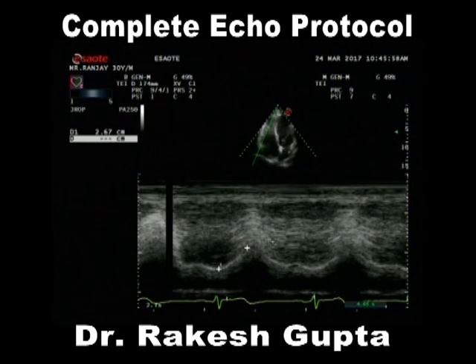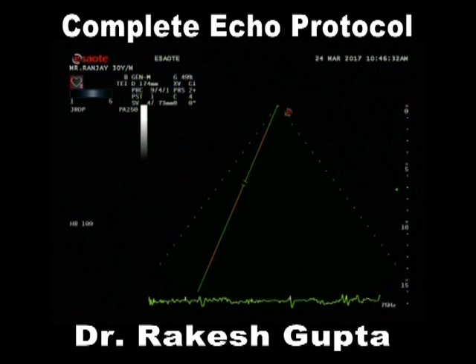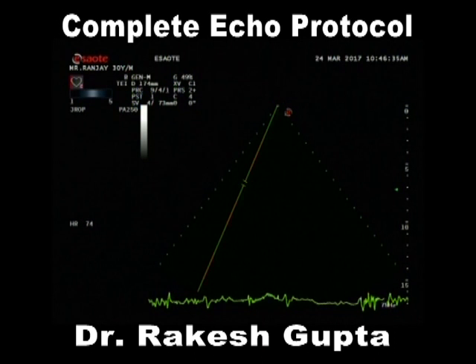And why is the systolic function of the RV more important? The basic answer I can give you again and again is, think of a pulmonary embolism. What makes a difference in the outcome of a pulmonary embolism? What makes a difference in the treatment modality of a pulmonary embolism? If you show a thrombus, and the patient has poor RV systolic function, this is the time you have to react very fast, versus a person who has normal RV systolic function. So calculating RV systolic function becomes damn important during all these procedures.